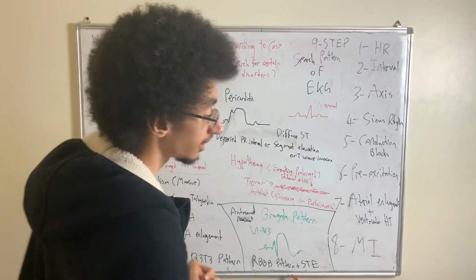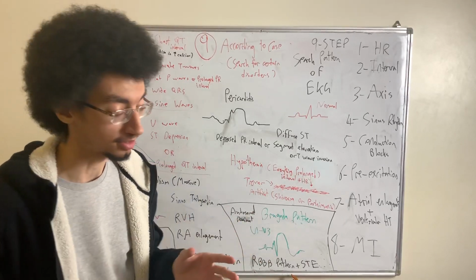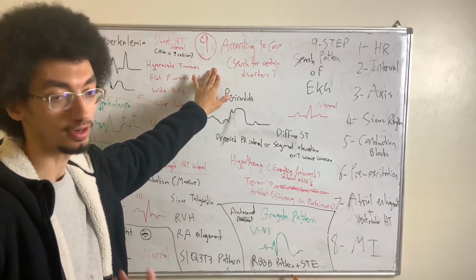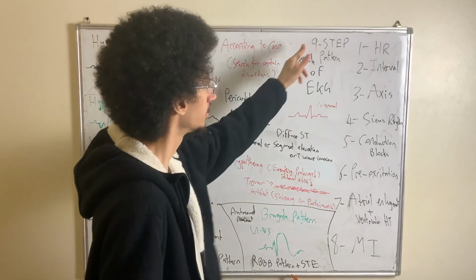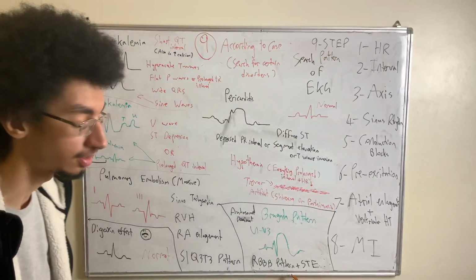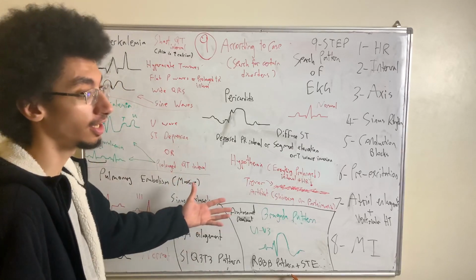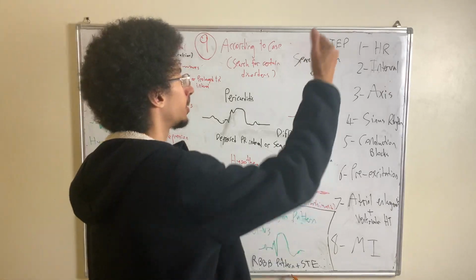Alright, so now let's finish with the final video of our lovely EKG series, where we're going to be talking about step number 9, the final step of our EKG 9-step search pattern. Alright, so to revise one last time, we start with assessing the heart rate, right?